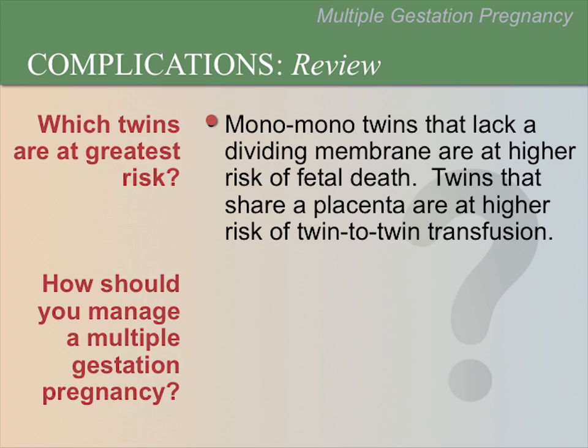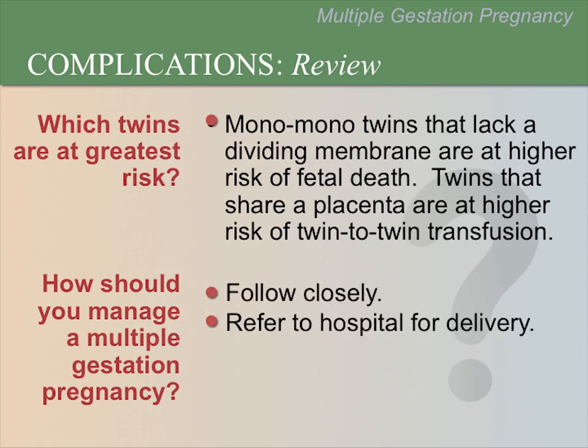Mono-mono twins that lack a dividing membrane are at a higher risk of fetal death. Twins that share a placenta are at higher risk of twin-to-twin transfusion. How should you manage a multiple gestation pregnancy? Always follow these pregnancies closely and refer for hospital delivery.